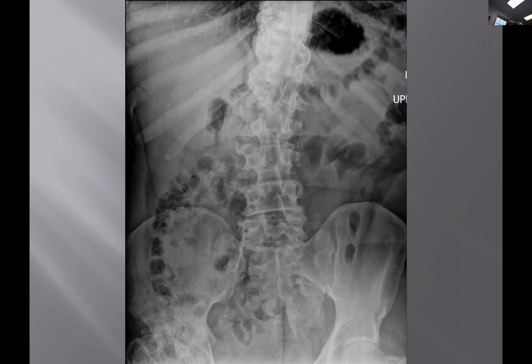Left T10. All right, so this is going to be the air bubble. So we'll go left, right. The rib pain's on the right. That would be right T10. Good. So 12, 11, and very good. It's at the corner, but there is our rib fracture. Everyone see it?